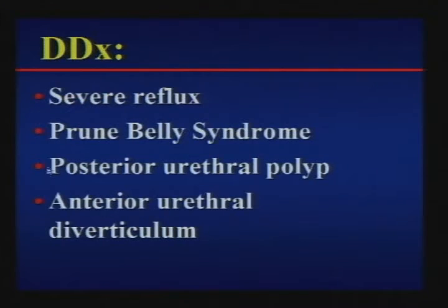But what's on the differential? Severe reflux, okay, but it won't dilate the posterior urethra. Prune belly can again give you generalized dilatation of the GU tract, but looks different. The big thing is the anterior urethral diverticulum, but that's not what this is. It's a posterior urethral valve.